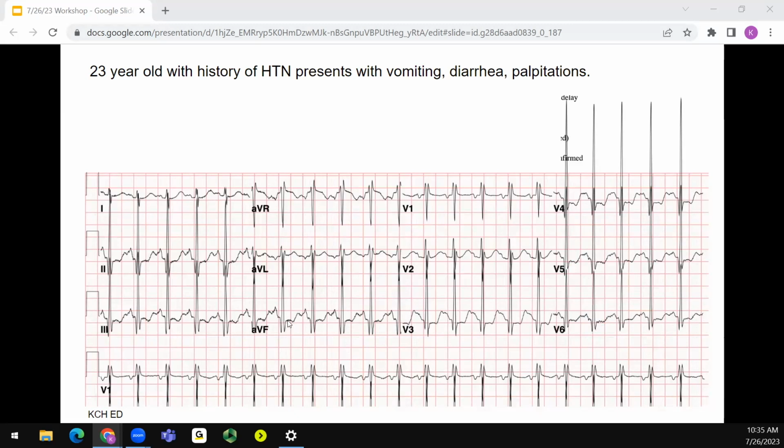This patient's K was, I think, 2. And if you calculate the QTc, which you should with your calipers and MDCalc, it's close to 520, like 524. Whenever you have a low K, what's the other electrolyte we always look at, even more than calcium? Magnesium. You're always going to check that.